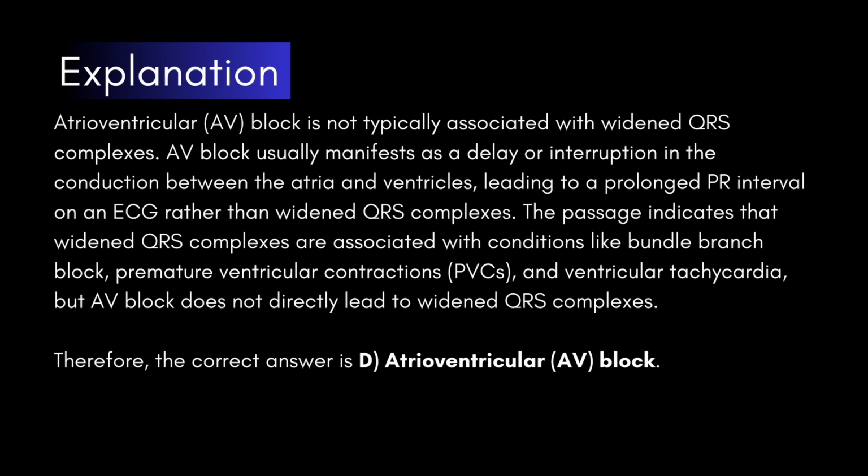Atrioventricular block is not typically associated with widened QRS complexes. AV block usually manifests as a delay or interruption in the conduction between the atria and ventricles, leading to a prolonged PR interval on an ECG rather than widened QRS complexes.